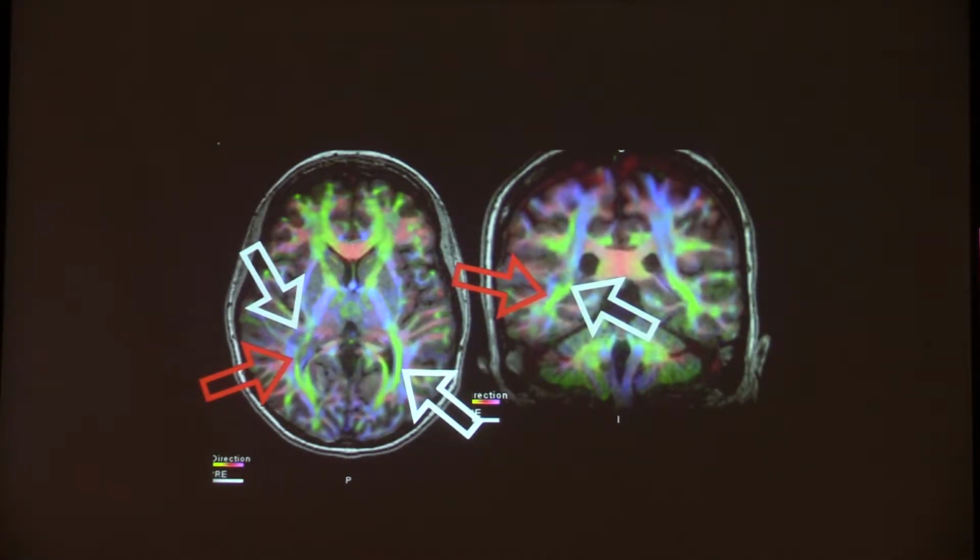And then, I talked about DTI before. So another reason why they didn't do it is because one of those nodules deep down, if they wanted to take it out, it's so close to the optic radiation.